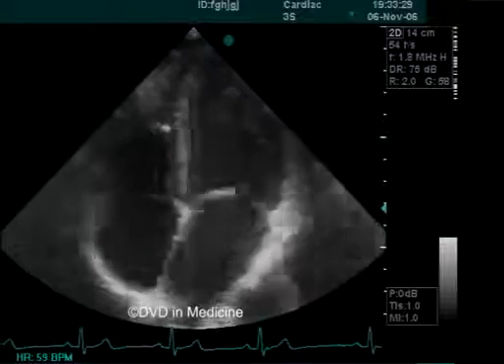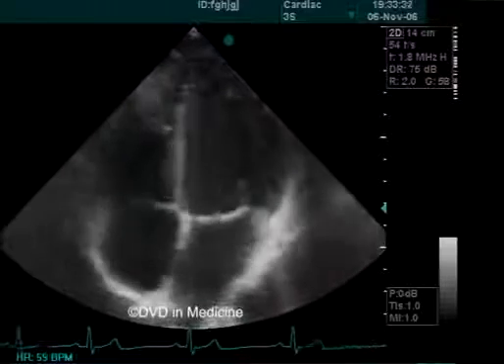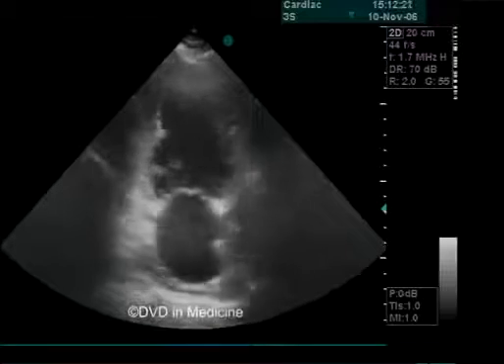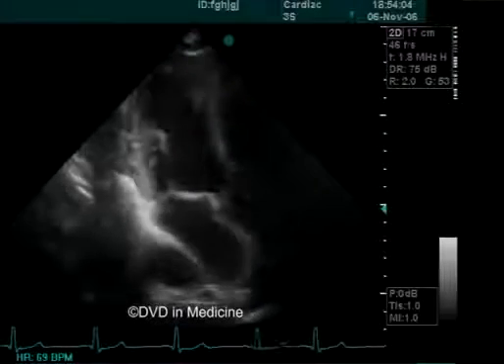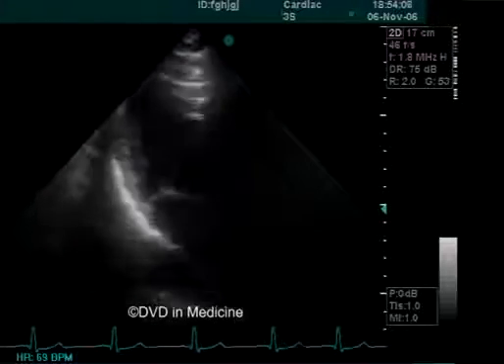An apical view allows, 1. To diagnose the congenital heart malformations in adults and children. 2. To assess the regional wall motion abnormalities in patients with coronary artery disease. 3. To perform a complete evaluation of mitral, aortic, and tricuspid valves.